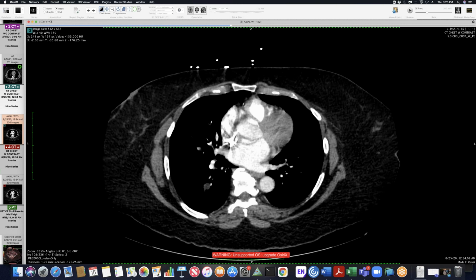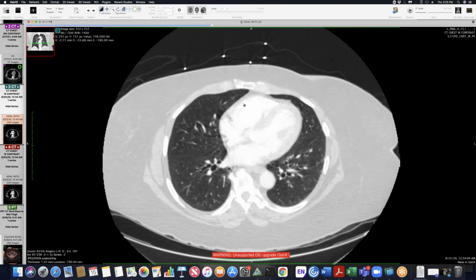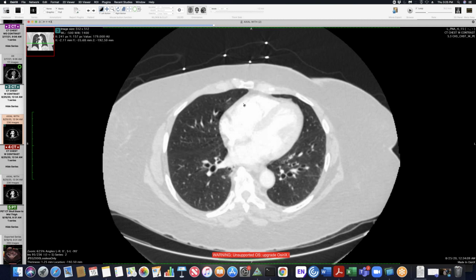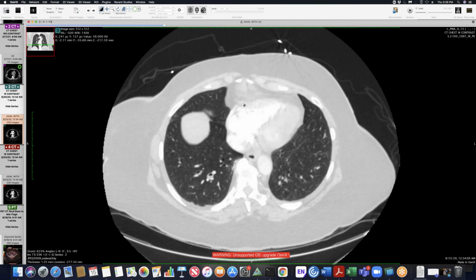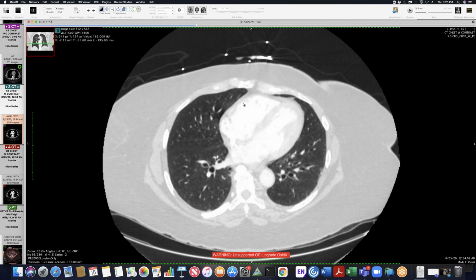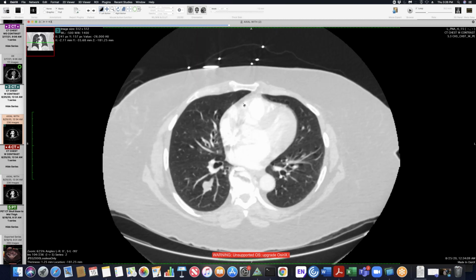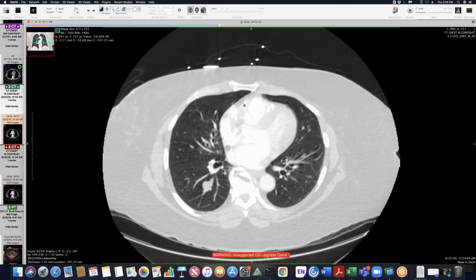I suppose so, but then it would just be coincidence that they had all the bronchiectasis in those segments there. Well, an endobronchial hamartoma could cause the bronchus to dilate or form a mucus plug and things like that. But don't they grow pretty slowly, David? I mean, usually they're there for many, many years. Peter, you said you went back a couple of years and it wasn't there. It wasn't there. Because that's a big nodule. I don't know, David, maybe I'm wrong, but I wouldn't expect a hamartoma to grow that fast.